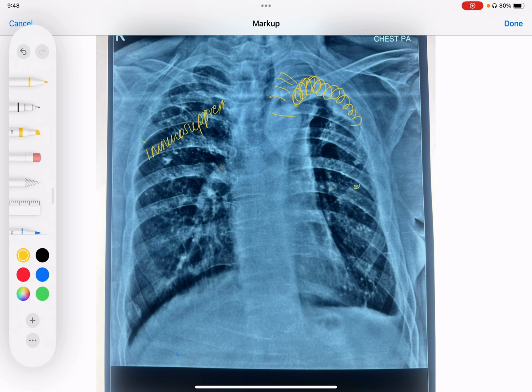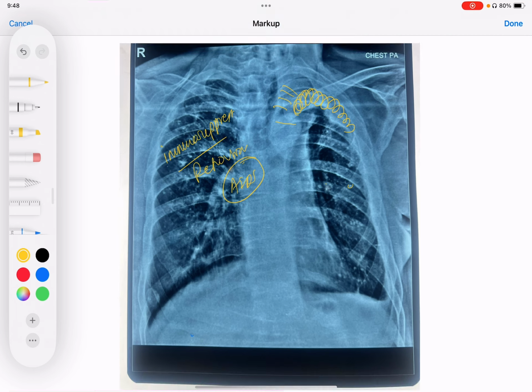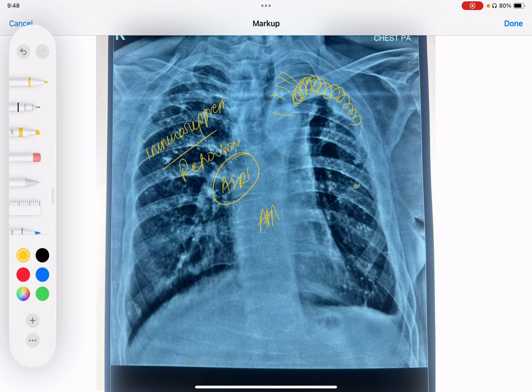And yes, this patient was retroviral disease positive, meaning this patient had AIDS for which he was on antiretroviral therapy. So that actually sums up everything: a patient who had HIV, who had an immunocompromised state, who had tuberculosis, with that tuberculosis involving bilateral lung fields that caused the lung fibrosis, multiple lung lesions, calcification, and now presenting with this type of typical lung feature.